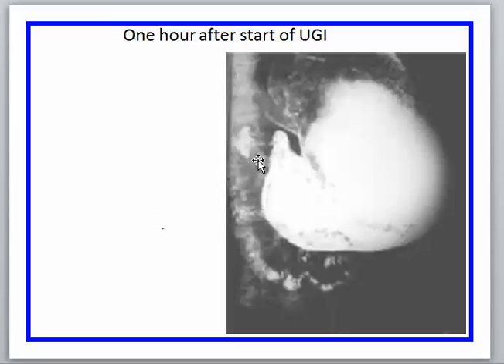Now going to this area again, in hypertrophic pyloric stenosis you can see only one line and nothing here, or you are able to see the whole thing, cap and canal. But in this type, this canal is more than half a centimeter and it is elongated. An elongated pyloric canal is a manifestation of hypertrophic pyloric stenosis.